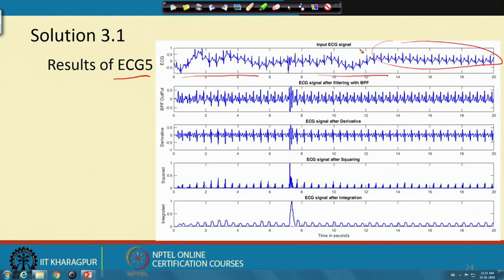Now, after the band pass filter, the baseline wandering is removed, and here we had a jagged peak that is giving a high output. After the derivative filter it is also the highest. After the squaring operation, this remains the highest one. Here we see all the other QRS complexes seem to be much lower than that. Okay. So, it is dominating the scene.